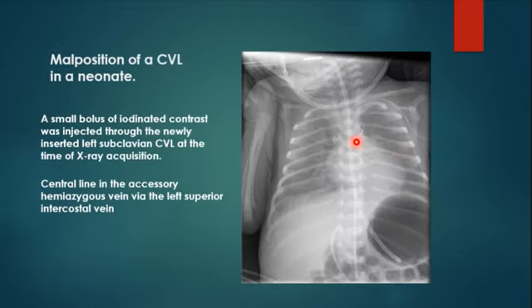In this case, the neonate was in the intensive care unit and had some hyaline membrane disease. You can easily recognize the ground glass attenuation, the air bronchogram, and a slightly resolving pneumothorax. He also has an NG tube, which we'll talk about later.